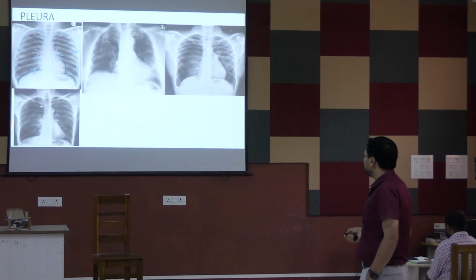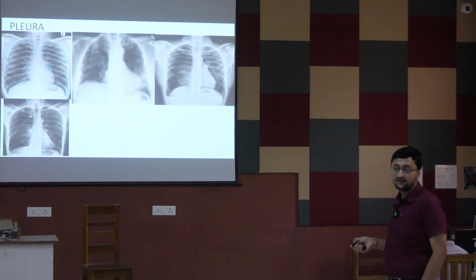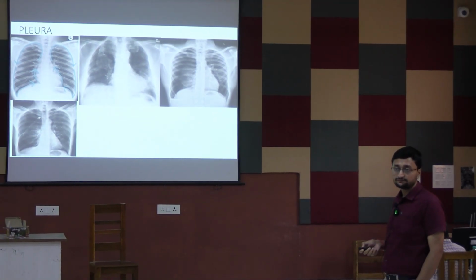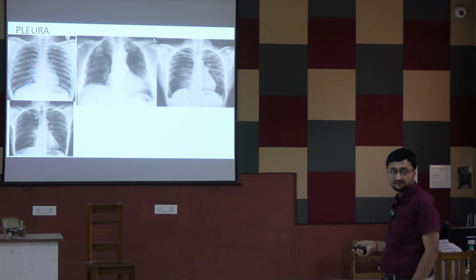And this is another X-ray of this patient. Any abnormality? This patient, so this is chest drain, intercostal tube drain. দেখ এখানে pneumothorax রিজলভ করে গেছে, এখানে pneumothorax নেই। And chest tube in situ. Clear?